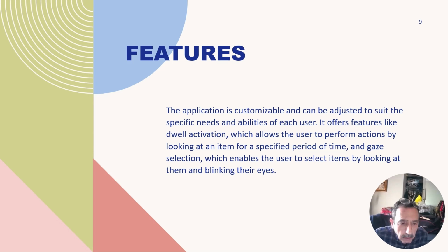The HawkEye application is customizable and can be adjusted to suit the specific needs and abilities of each user. It offers features like dwell activation, which allows the user to perform actions by looking at an item for a specified period of time, and gaze selection, which enables the user to select items by looking at them and blinking their eyes.